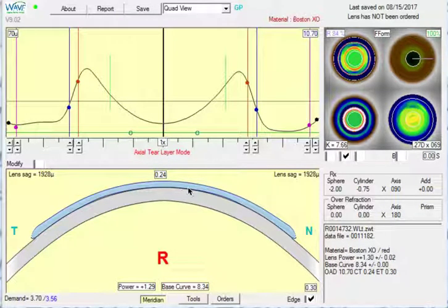So in this orthokeratology case, we want to go back to a previous lens design. And what we have right now is the GSIM design. That's the second lens, or the most recent one. And Wave does only allow you to duplicate the most recent lens. So either create a new lens in RSIM, or you can import your RSIM lens into here.